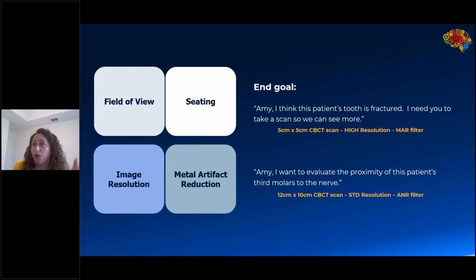You have 4 files you need to save instead of just 1. So each one would take up space on your server, and you're not really doing the patient any good. You're spending time looking at 4 scans, opening each one of them instead of just taking one and doing everything on one same case.